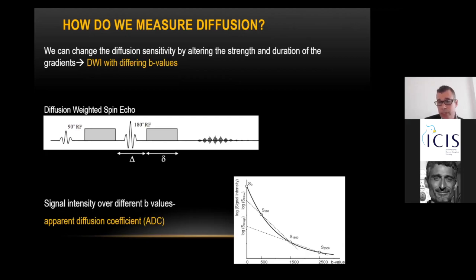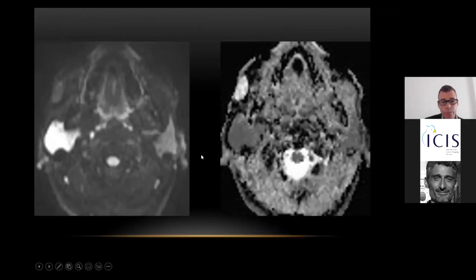The diffusion-weighted imaging is innately T2 weighted sensitive because it requires a long TR in order to gain enough signal, and it also requires a long TE in order to incorporate this diffusion gradient after the refocusing pulse. So we will routinely create diffusion-weighted imaging depiction at high B values, and we will compare those with the map created from the ADC.